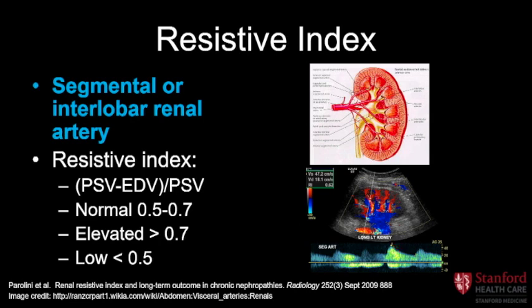That means it's unitless because the units cancel. This example here, we're angle correcting, but you don't need to angle correct, because by angle correcting you're just dividing cosine of theta by cosine of theta. So that also cancels. So you actually don't need to angle correct.